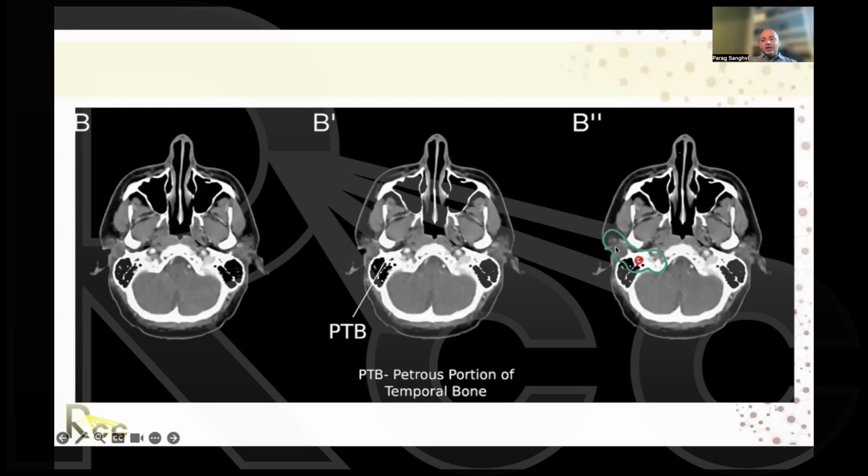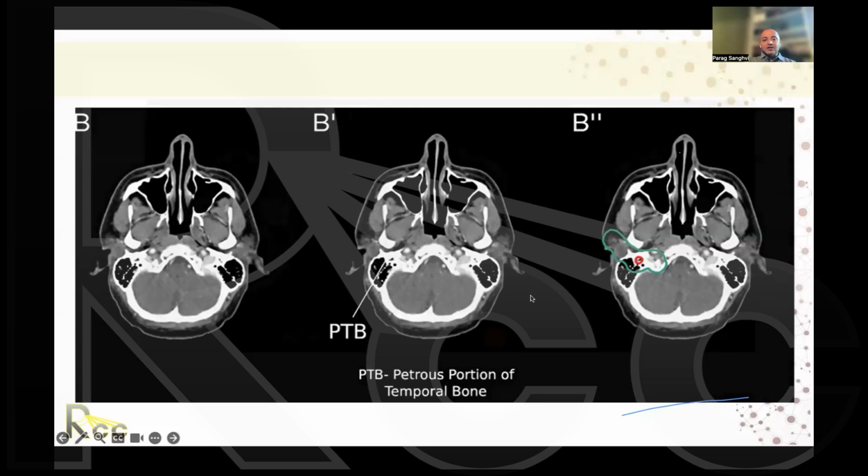This is showing you the contours as you're going through the middle segment of the nerve. I wanted to show you, your stylomastoid foramen would be here. I usually very, very generously contour at least the anterior 1/3, if not the anterior 1/2 of the mastoid segment. So you don't have to get very cute here, but this is that petrous portion of the temporal bone. You have to generously cover this to cover the nerve.